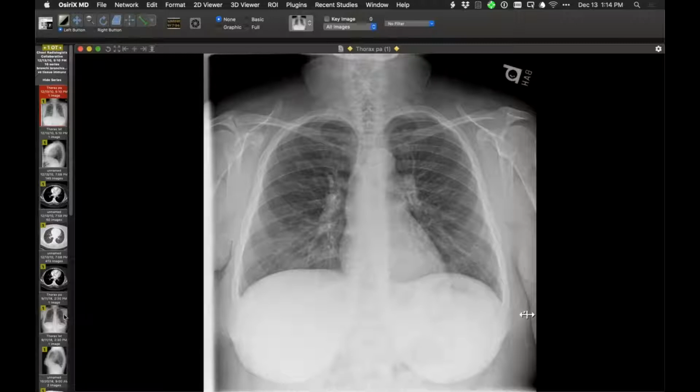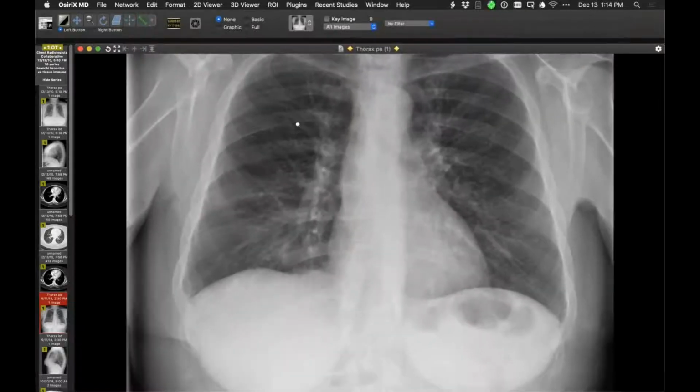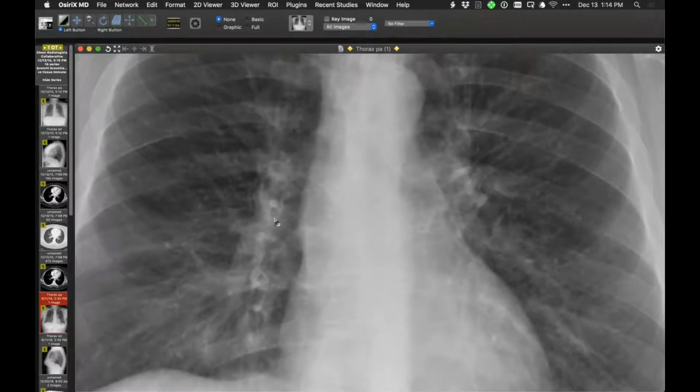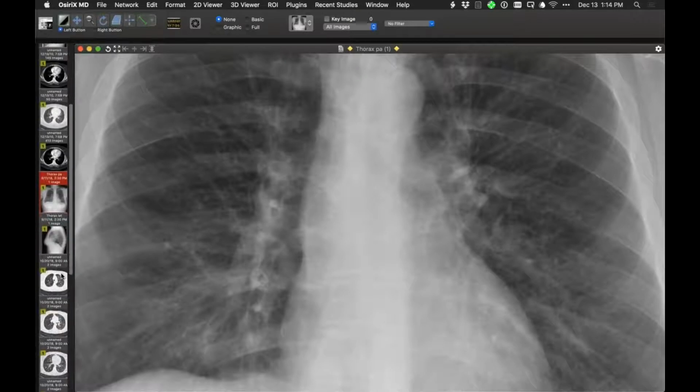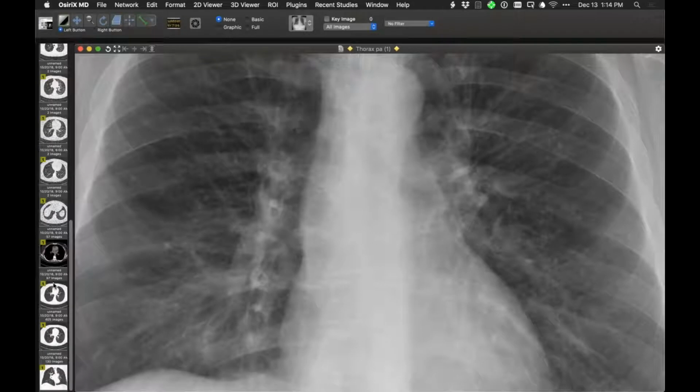So the radiograph is unremarkable, but I will show you that this radiograph, which is more recent compared to the one I showed you, which was from 2010, and you'll see this is really subtle, but these airways here that are slightly dilated with slightly thickened walls turn out to be substantive in this person. So I'll show you the CT now from the most recent CT.